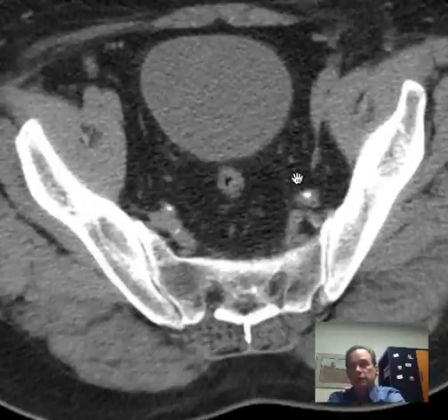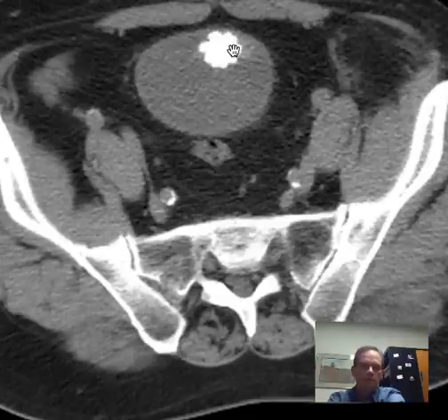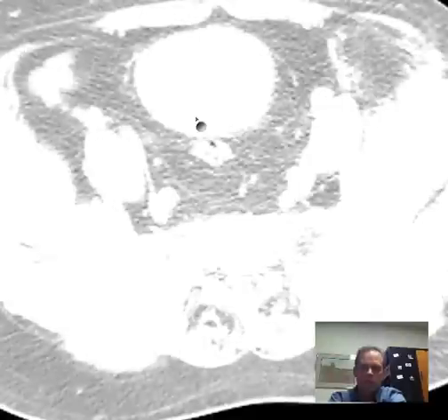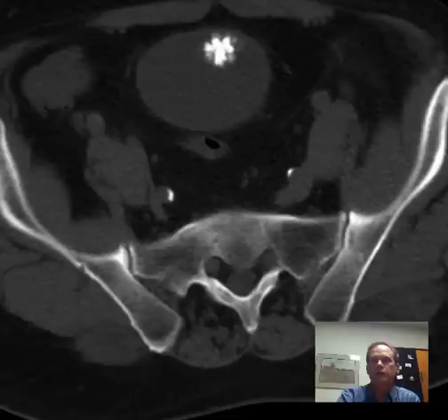And what we do see in this bladder, though, is a nice example of a bladder stone. We don't see those very often. I may see a handful in the course of a year or less. But this is a nice one because it's stellate. It has a nice margin that looks kind of irregular, but kind of a star-like configuration. So this is a good example of some of those principles, as well as a nice finding of a bladder calculus.